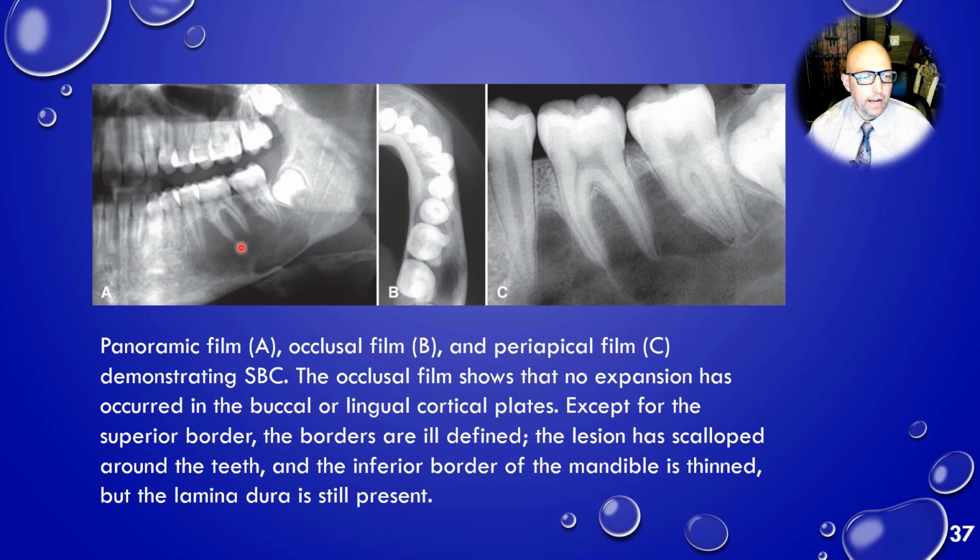Here's panoramic. This is one that kind of has that multilocular appearance. I imagine it's more kind of scalloping within the borders around it, but it can have a multilocular appearance. If you see really close, and here let's look at the periapical image. Do you notice the lamina dura? Lamina dura remaining intact all around the lesion. So that appearance right there strongly shouts, in my mind, this is a simple bone cyst. Scalloping, lamina dura. We said OKC can scallop. It seems like OKC tends to erode the lamina dura more than a simple bone cyst, but it could have a similar appearance to this.